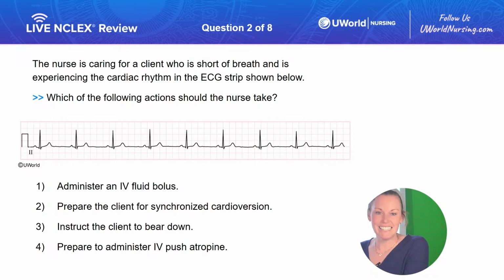All right, 30 seconds on the clock. Go ahead and drop those answers in the chat. And I'm going to give you guys a hint on this. Sometimes you're going to see 10-second ECG strips. Sometimes you're going to see 6-second ECG strips. But what you're seeing here in this strip is a 10-second strip.